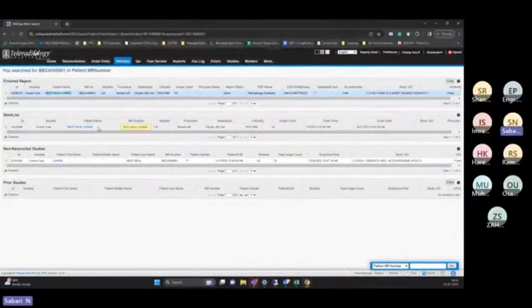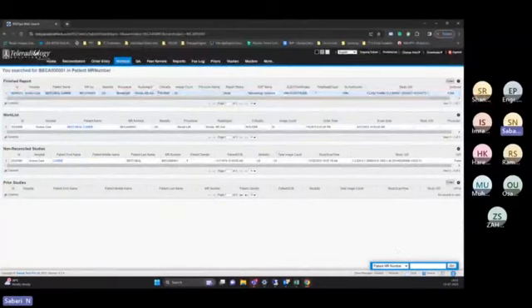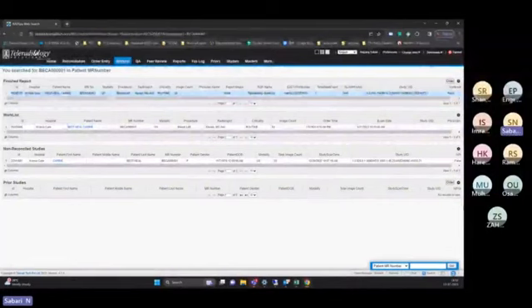If you put it here and search, this patient already has one scan. It is in the finished report. Now one more scan is there in the work list and another scan in the reconciliation tab. So it will show all those things on the screen. So that is called a global search. So whether this patient has any number of scans, 5, 10, or 1 only, if you always do a bottom search, it will be good. It will fetch everything from the application.